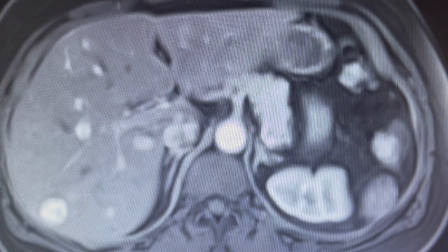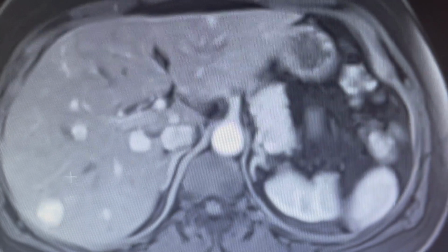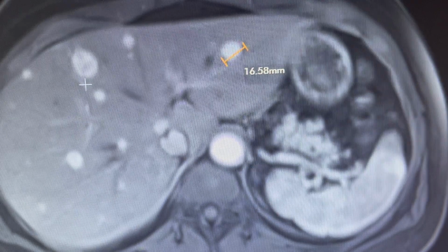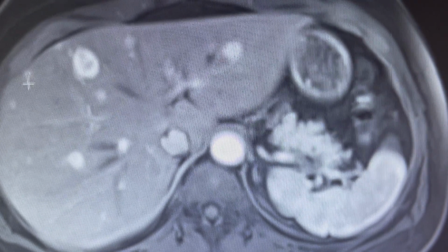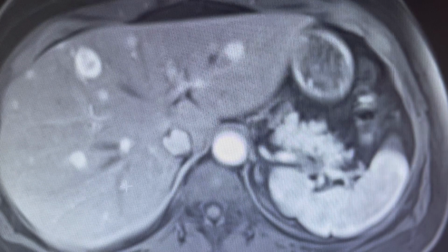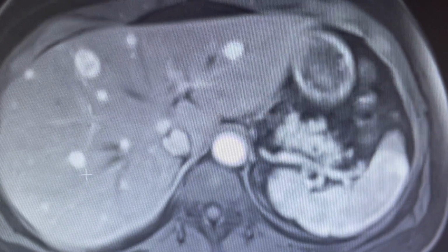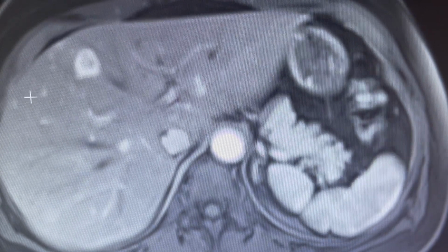Now we can see these lesions, and I want you to pay attention to the fact that they show largely very intense, extremely intense enhancement, the larger ones with some lack of central enhancement. But now suddenly we're seeing maybe additionally beyond the 10 to 15 we saw on non-contrast images, we're seeing about 20 lesions which show increased arterial enhancement.